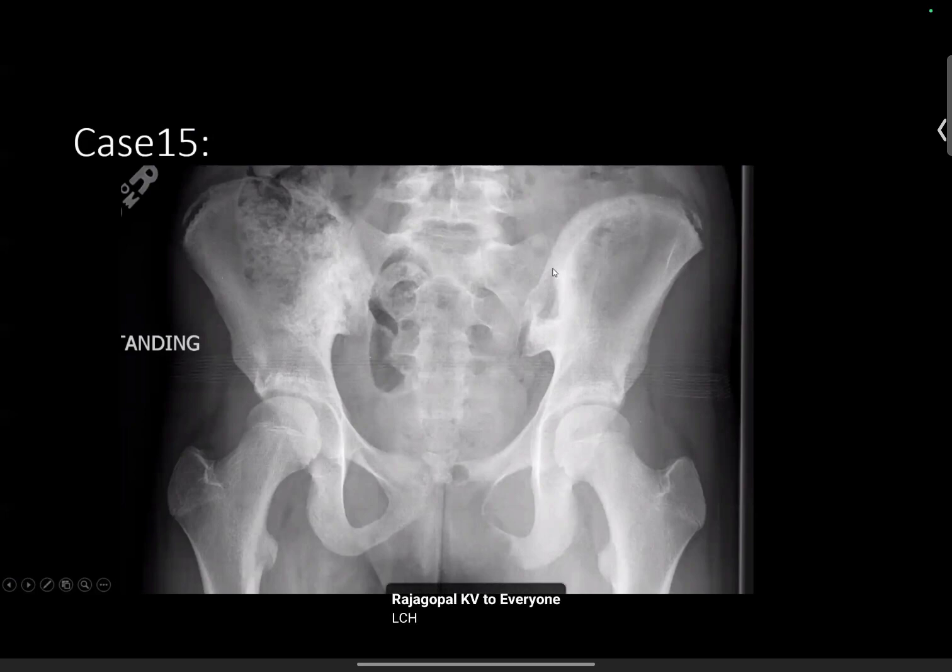There's another lesion here. It's a lucent lesion with a more well-defined margin and sclerotic rim. So this is a bit confusing, right? And we don't necessarily know what it is right away. We do want to worry about Ewing's, but this was not Ewing's. Orthopedic surgeon called me and said the family is very distraught. Is there anything else this could possibly be?